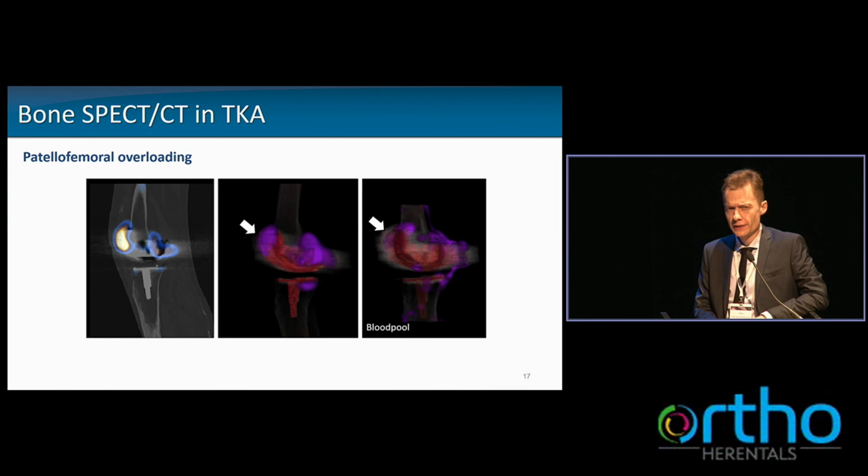So that's why we are now taking this one step further, because, of course, if you do SPECT-CT in the late phase, you have this wonderful, complicated 3D anatomic data set, but you kind of tend to lose your third dimension when you need to compare this with your planar blood pool image. So that's why we have now implemented in our daily practice a clinical protocol of blood pool SPECT imaging followed by late phase SPECT-CT.